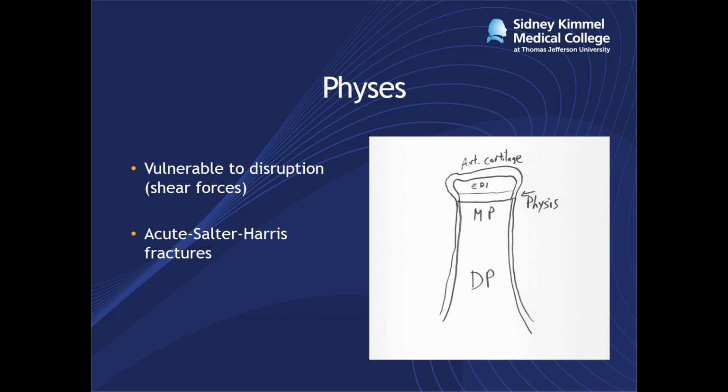Many of the lower grade injuries are diagnosed on radiographs and do pretty well with conservative therapy, although occasionally we do see higher grade injuries on MR, so I'll show you an example there. And then the chronic injury to the physis, just typically from repetitive loading.